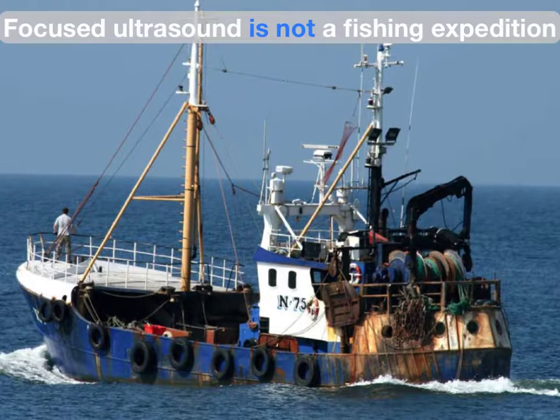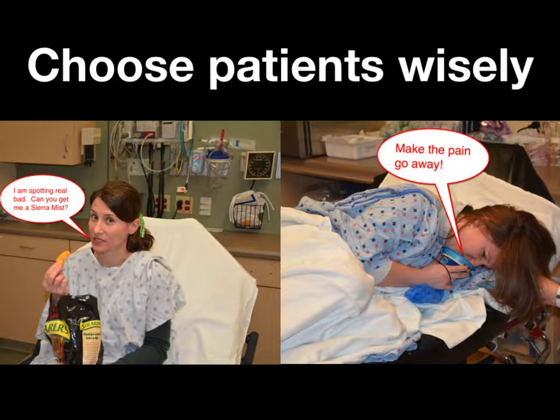It's important to remember when performing the focused first trimester exam that it's not a fishing expedition. We're going in there to answer that specific question. Does the patient have an intrauterine pregnancy? Remember, you want to choose your patients wisely when performing this exam and really ask yourself, do the sonographic findings of an IUP explain the patient's symptoms, and does it allow you to safely discharge them home?